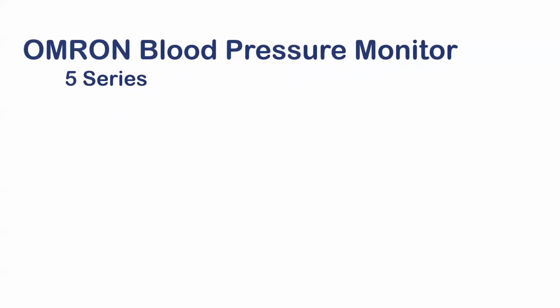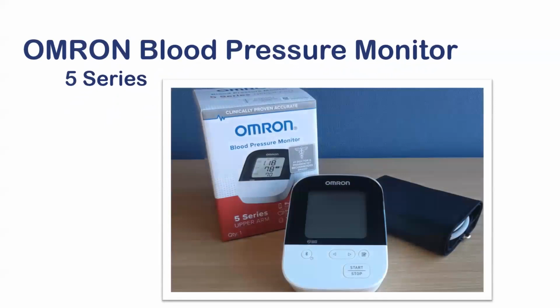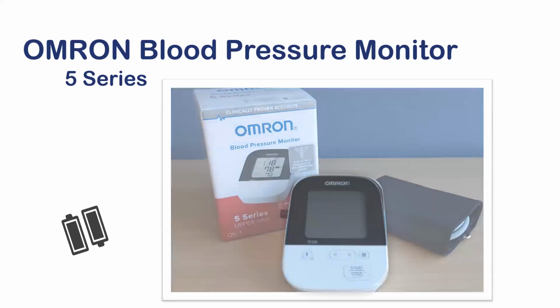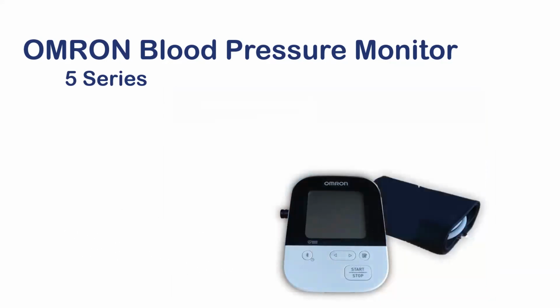Before you can connect your blood pressure machine to the Sphygmo app, you will need to put together your blood pressure machine. In the box with your blood pressure machine, you'll find the machine itself, a blood pressure cuff, instructions, and batteries. First step is to put the batteries in the blood pressure machine. Please pause the video for a second so you can put the batteries in the blood pressure machine. Press play when you've completed this step.